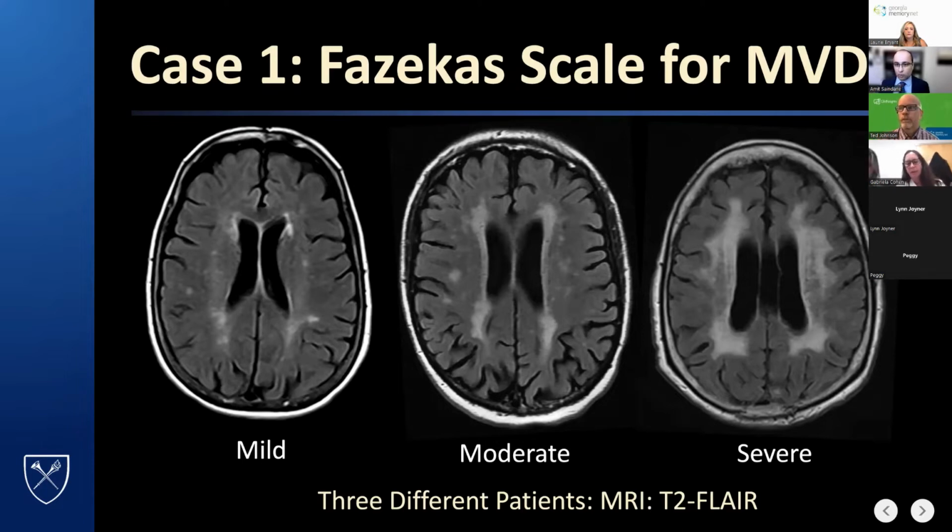So when you see a report come across and it says mild microvascular ischemic changes, that's what we're talking about. And if this is an elderly patient, it's going to be incredibly common, and they're probably unlikely to have a totally normal brain. If you've got someone in your 80s, 90s, not to have a little bit of this. But when you start seeing things like this is where you may start to think that there's a vascular component to the dementia. When there's this, or you're seeing cortical infarctions, lacunar infarctions.